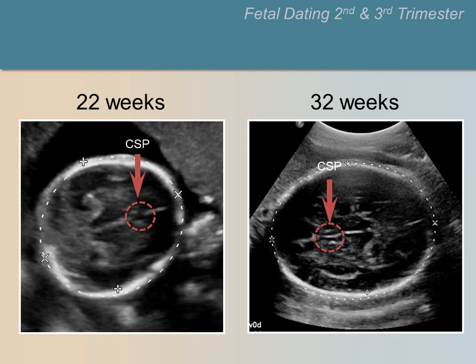Can you find the thalamus in each image? Please pause the video now to invite the group to find the thalamus in each image.